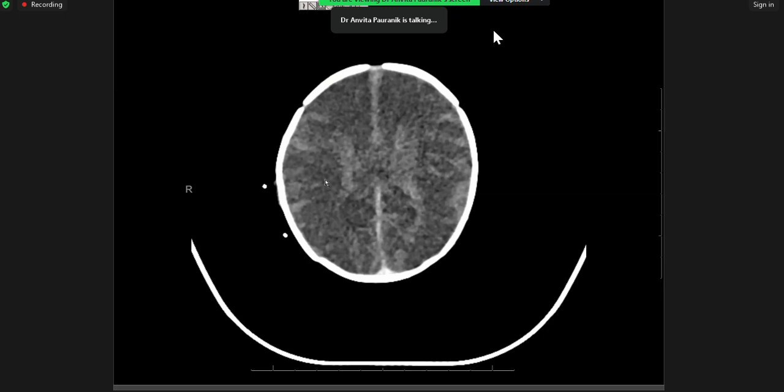So we were able to tell them the prognosis is bad. If the clinical features are terrible, they may have to make a decision about withdrawing support. That is the role of CT in this scenario. We will obviously be doing MRI, if we have to pick up early HIE, in pre-cooling or post-cooling scans. We will see some examples of those also. But first, I'll just show maybe one or two more CT scans.